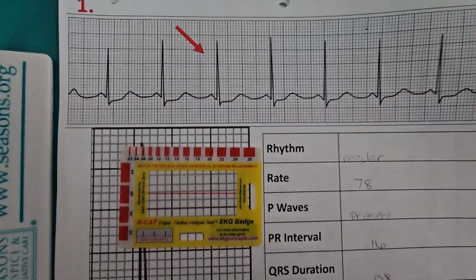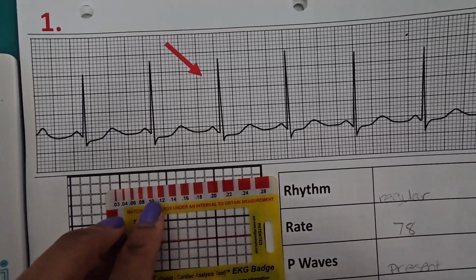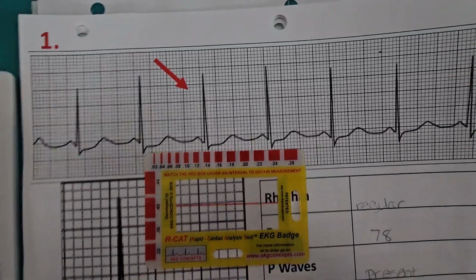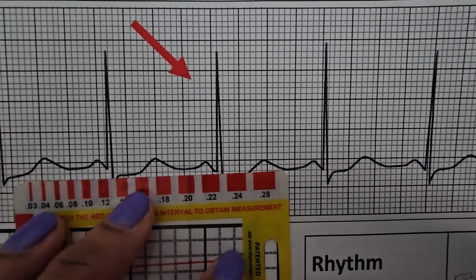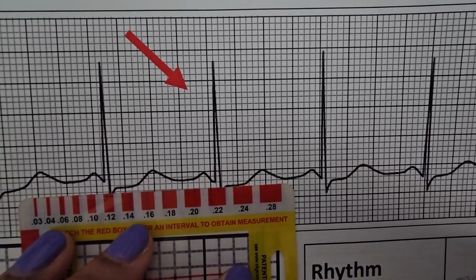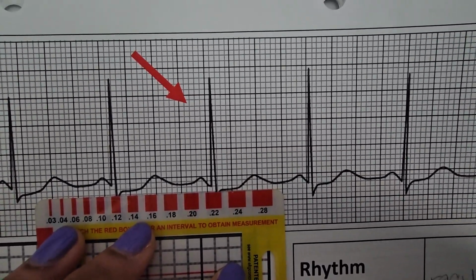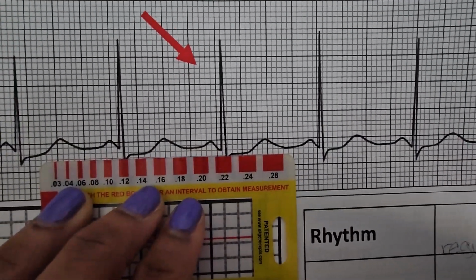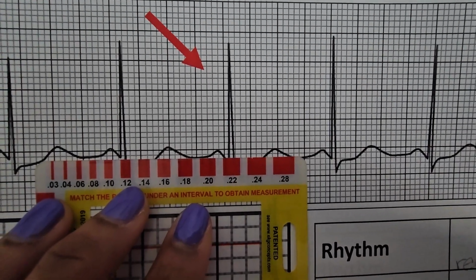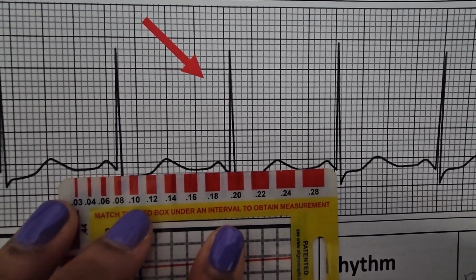So for QRS duration, your QRS duration should be less than 0.12. I know that it's supposed to be less than 0.12, so I immediately go here. That's the beginning of my Q wave. I kind of go down. So that's my S wave here. And I get 0.1. Actually, no, I don't get 0.1. Excuse me. So I see that I have my Q, actually, I'm sorry, here. And I see that it kind of goes over. And I go down to 0.08.